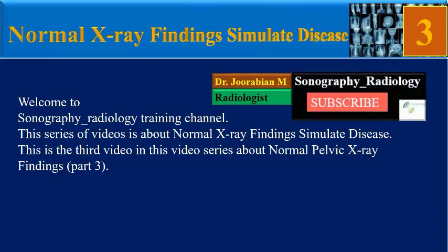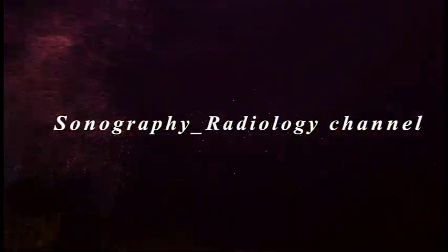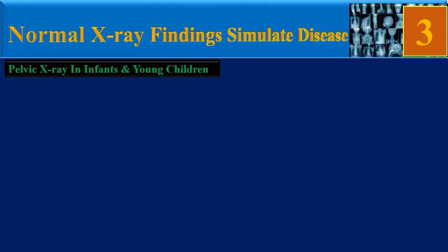This series of videos is about normal X-ray findings that simulate disease. This is the third video in this series about normal pelvic X-ray findings, part 3. We will review 10 cases together.